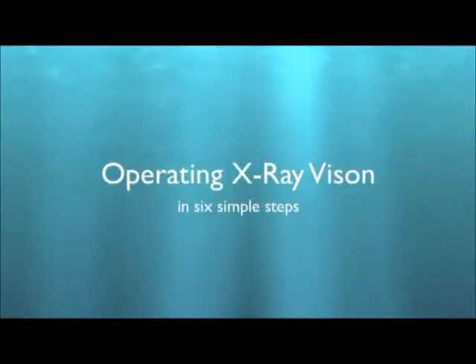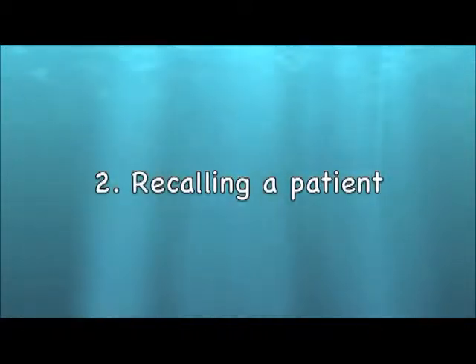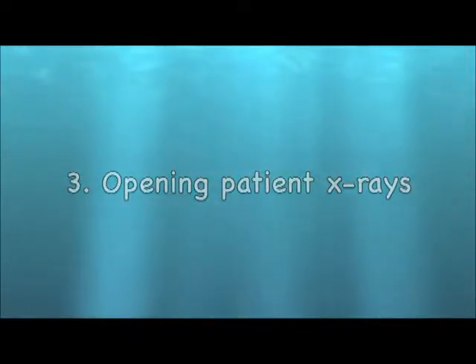Let's take a look. There are 6 things that we're going to show you today. How to enter a patient through Name Grabber, how to recall that patient later after they've been entered, how to open that patient's x-rays, how to take an individual x-ray, like a single PA, how to take a layout or series of x-rays, such as an FMX or bite wings, and how to export the image so it can be sent to a specialist via email or attached to an insurance claim.